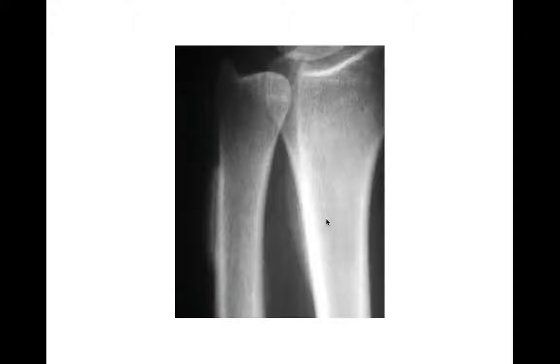All right, another radiograph here of the distal radius and ulna. Here we see this laminated periosteal reaction along the radius and to a lesser degree along the ulna right here. Very focal, heaped up right here, these alternating layers of sclerosis and lucency and sclerosis. This was periosteal reaction, which in this case was due to HPOA, hypertrophic pulmonary osteoarthropathy, usually due to some underlying thoracic process. Often it could be a lung cancer, though it doesn't have to be. Any kind of thoracic process can cause this sometimes. So this was a periosteal reaction from HPOA.